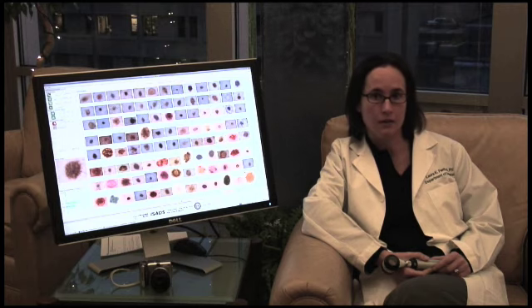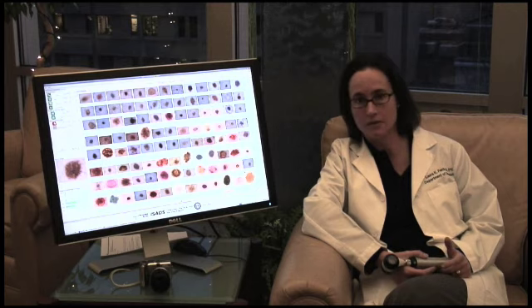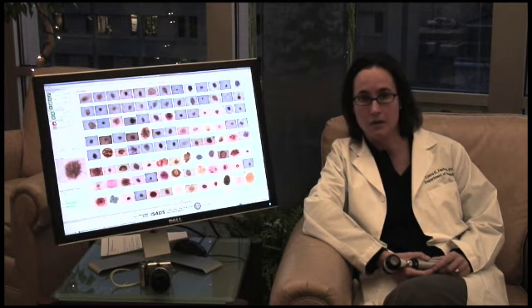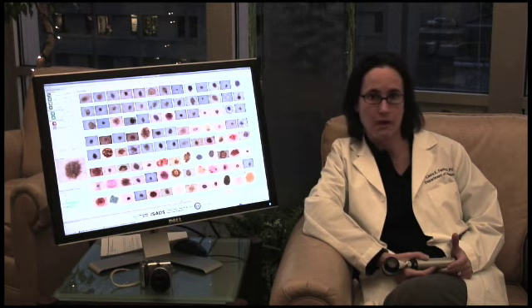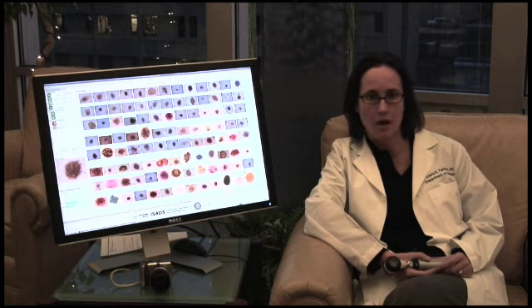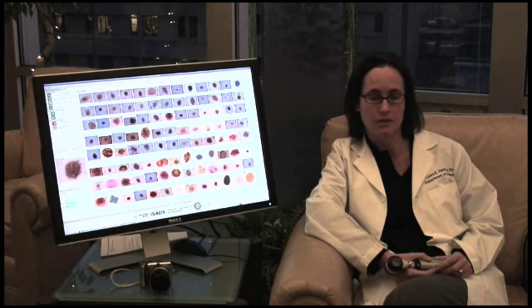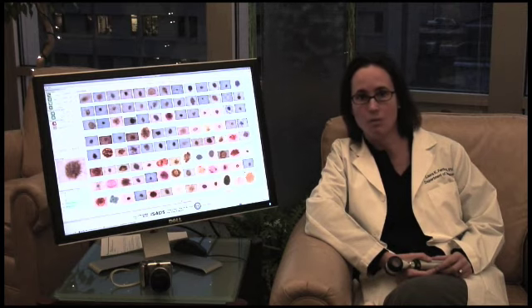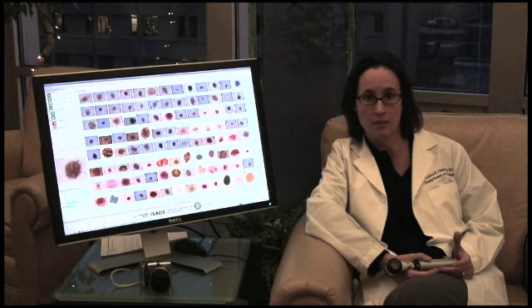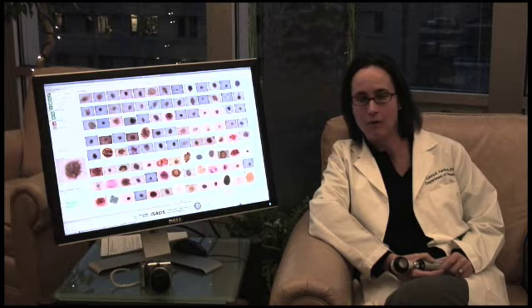One way to do that is to process that image and get some information about it, such as the size of the mole and how symmetric it is. We also want to be able to compare the image of the mole that we're seeing on a patient in the office with images in a library of multiple moles, and see whether the mole in front of us looks like one in the library, and if so, what the diagnosis of that mole was, to give us a better idea of what we're looking at. And this is where ISADS for dermatology is a powerful tool.